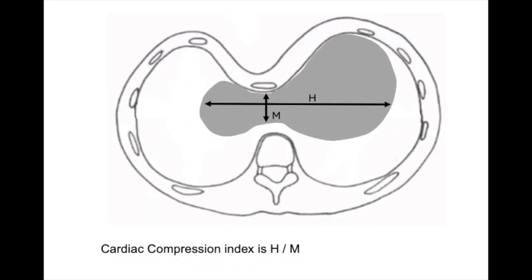The measurements we're hoping for you to collect are in 3 parts. Firstly, the chest cavity, which we've just covered. Secondly, the cardiac heart parameters. And thirdly, a vertical measurement. So this is the second part. And this, I think, is super important, the cardiac compression index. NHS England will allow NHS surgery even now if we can prove that there is cardiac compression on CT scan or equivalent imaging. So actually we need an index, and we're not collecting this at the moment.